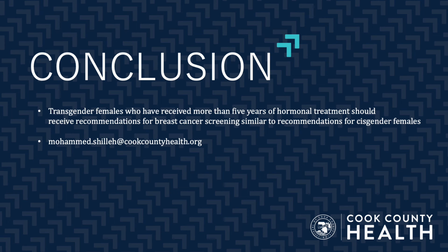So we just reviewed 3 cases of transgender females who can present to a breast imaging clinic with pathology, but also with regular tissue that can be very similar to a cisgender female. Transgender females may augment their breasts either hormonally or surgically with implants. And if they have received more than 5 years of hormone treatment, a good recommendation to follow is that breast cancer screening should be similar to cisgender females.